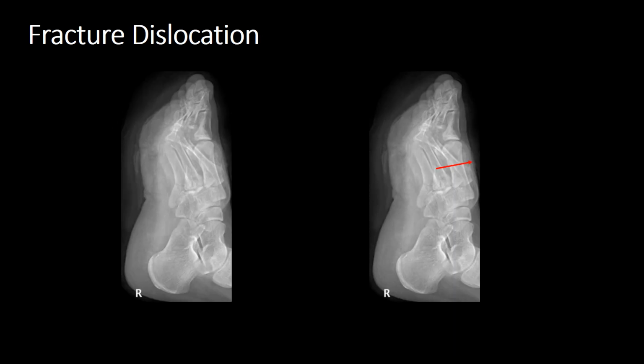And now on our lateral view, we can see how the metatarsals have actually moved dorsally, in particular the second and the third, and of course the first.